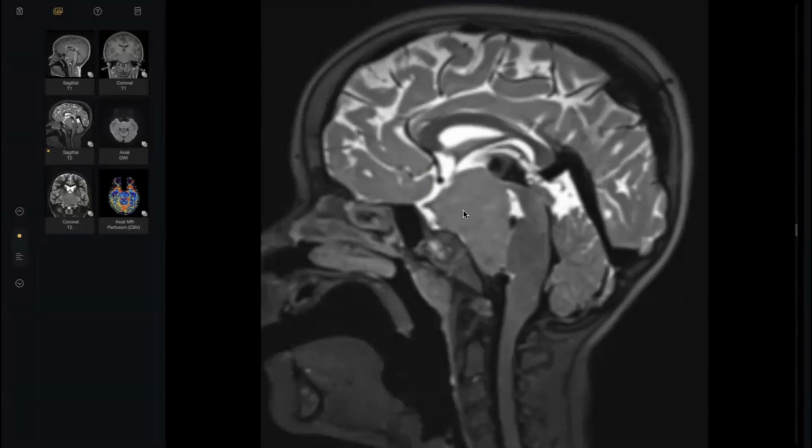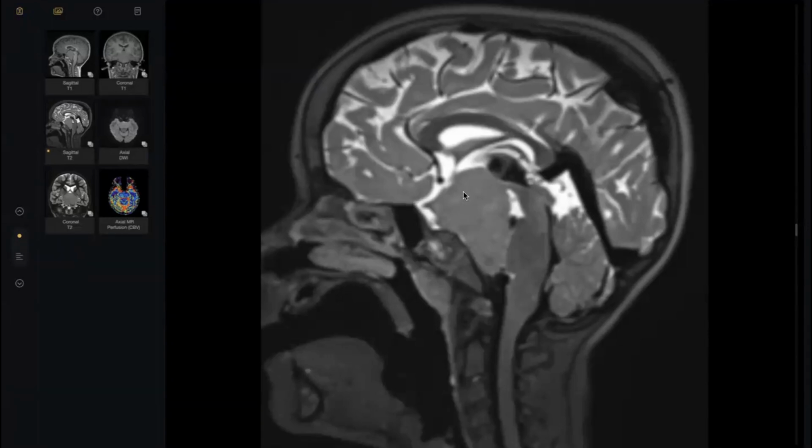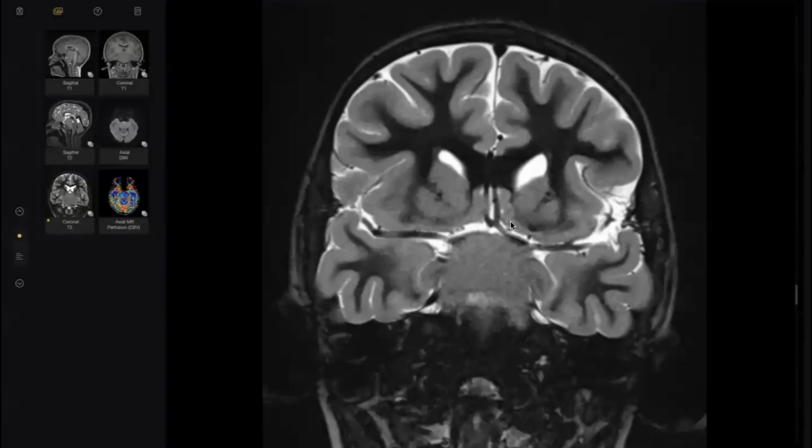Number two, it is impossible to be craniopharyngioma because the patient is young, 7 years old. And craniopharyngioma at this age must be cystic, with high or almost high signal, motor oil signal in T1, plus calcification. Really, doctor, I think there is no calcification here.